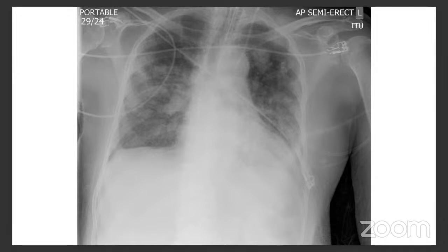But on a large area of fibrosis with volume loss, you can mention a chronic thing. But in a COVID situation where you have patches of fibrosis, you can't really tell. Only time will tell. Even on follow-up CT scans, many of the areas you think of as fibrosis can resolve. Some are permanent, which are definitely fibrosed and non-functioning lung.